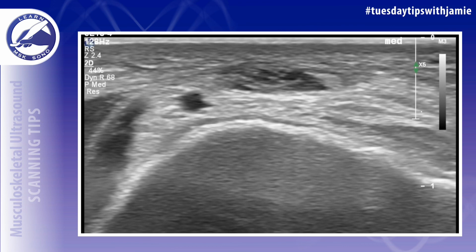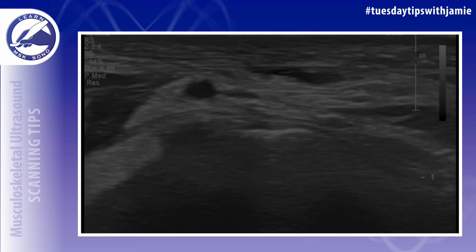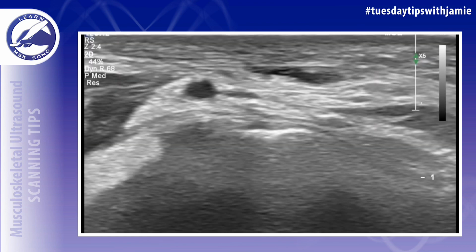When retraction is present, you want to locate the proximal and distal tendon stumps. Retracted tendon stumps typically appear hypoechoic and thicker than the normal segments of the tendon. So in this case, you could see where it was normal tendon, then it looked hypoechoic and thick right before you get to the spot where there's a loss of tendon fibers.